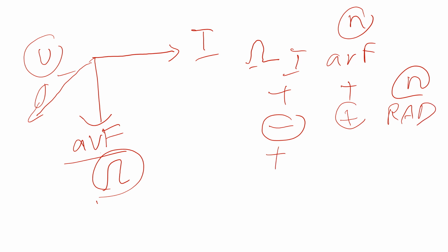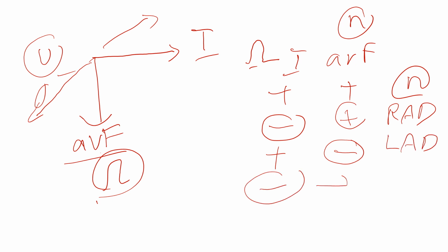If one is positive and aVF is negative, then we are having a left axis deviation. And if both are negative, then it can be situs inversus with dextrocardia, or we are having an extreme right axis deviation, normally found in extensive posterior wall MI.